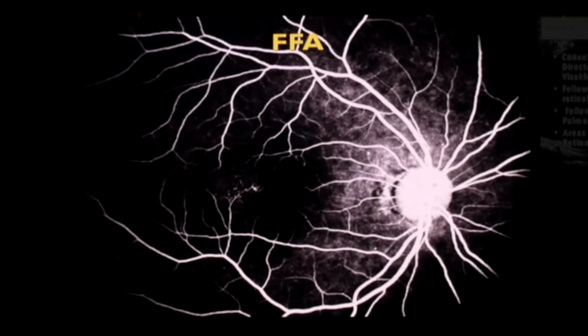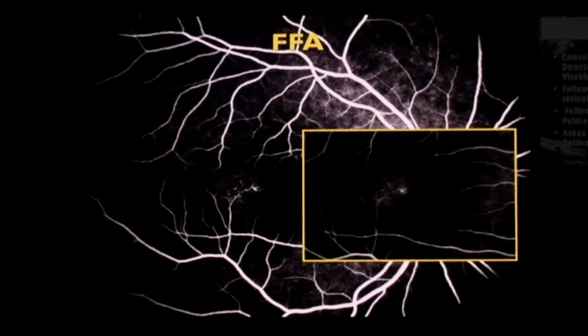On a fluorescein angiogram, we will be able to pick up the telangiectatic vessels better at this stage. Mind you, we are dealing with occult telangiectasia, not visible telangiectasias. Group 1 is visible, group 2 are occult telangiectasias. So in fluorescein, we're able to pick up most of them on the temporal side. Some of them can also be on the nasal side of the fovea.